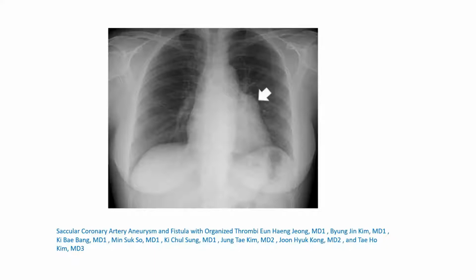But you have to make sure that sometimes the heart can have things that enlarge and go on this border or that border beyond the common structures on the left and on the right. So you have to be humble when you are interpreting the borders of the heart. You have to be humble. It's not always categorical, this is so and this is so. No. Okay? Remember this one.